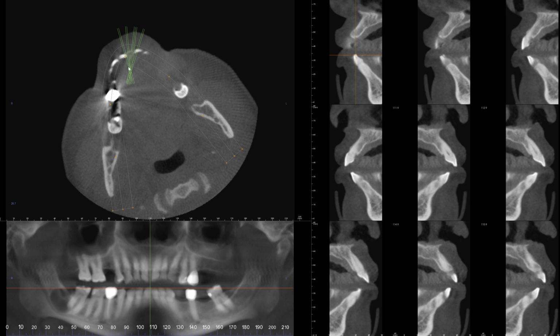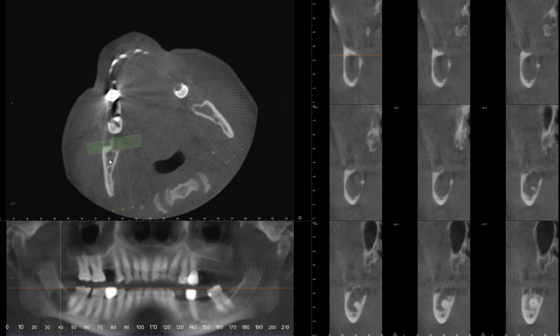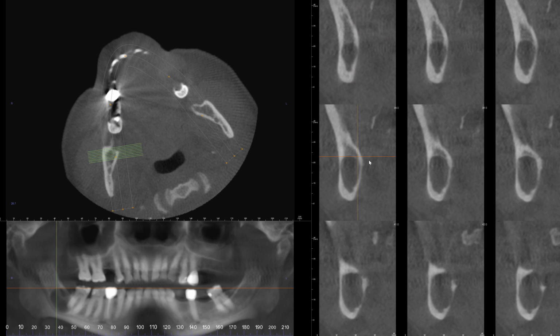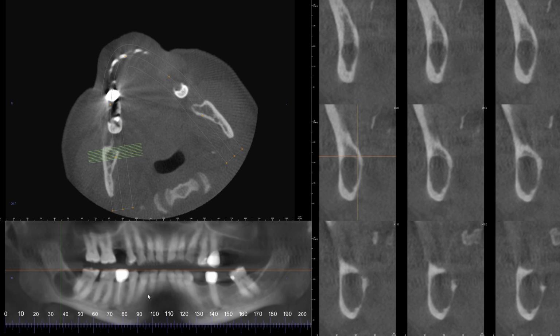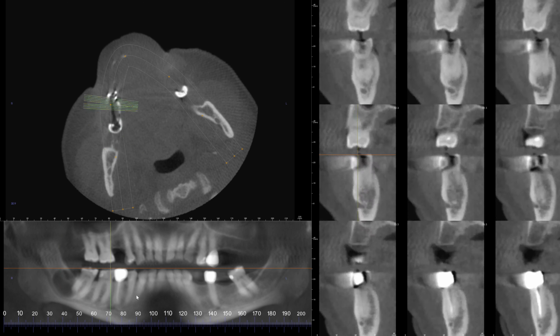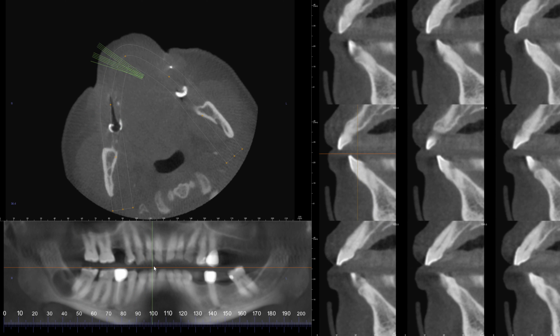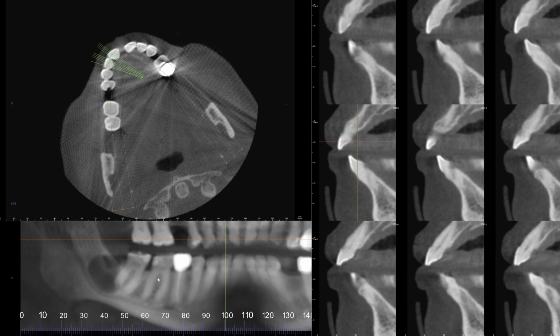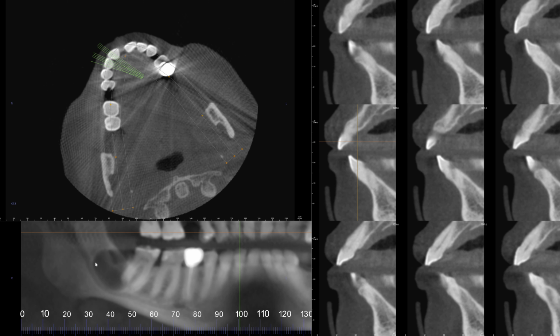So now we've already looked at the cross-sectional view from the corrected coronal section that I showed you earlier, but let's go ahead and look at the panoramic view that almost all of us are very familiar with. Again, keep in mind the patient is in their 60s, and right over here there's a lesion, and you can see the inferior displacement of the canal.